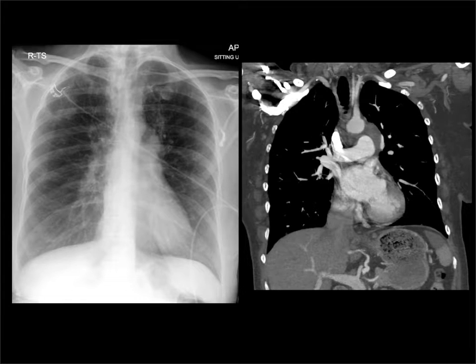And here's a patient with an abnormality in the AP window. This was a small cell cancer of the lung, and you can see coming out this big bulge here that shouldn't be here. But, you know, really not outrageously obvious on the chest x-ray. Just take off the lights here so you can see it. And here it is, much clearer seen, obviously, on the CT. All of this is abnormal. This was actually a big and inoperable tumour.